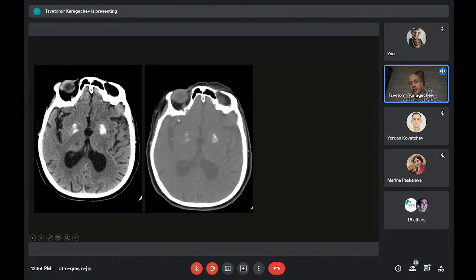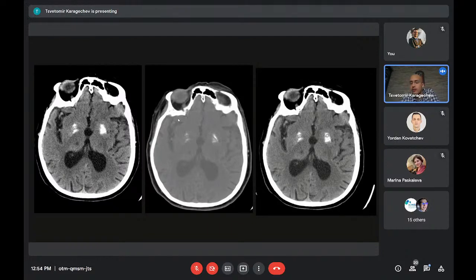The other thing that we can do is put a so-called region of interest measurement. You can see that on the top of the image, and if you measure it, this has a Hounsfield unit of almost 200. And if you remember one of the very first slices, I showed you that acute blood is like 40 to 90. Blood cannot be as dense as this. So this is calcification.